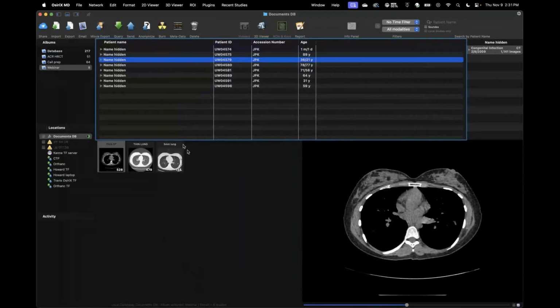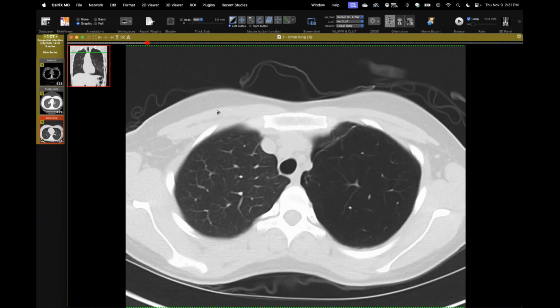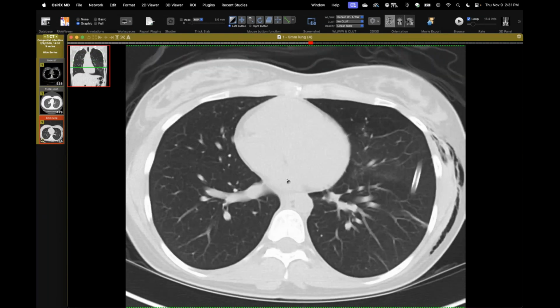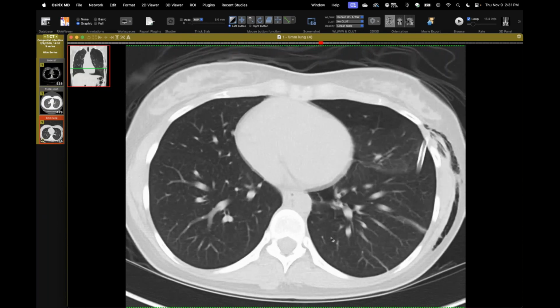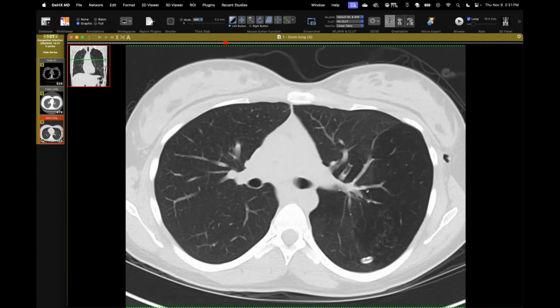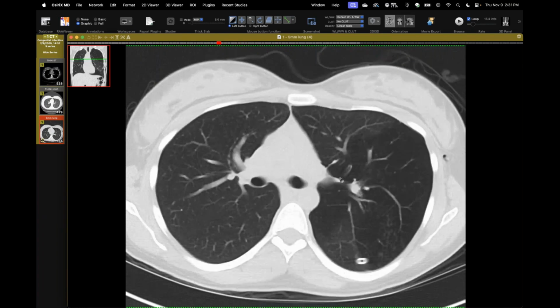This last case is kind of a fun case. I was going to show it previously. So this is an old scan. You can see this patient has a very abnormal lung, and I wish I had a radiograph, but I don't. At this point there's a small caliber pleural drain in, and we have these cystic spaces here, and then up high you have this hyperlucent lung and this dilated bronchus that comes down there and just ends, and a couple of other dilated blind ending bronchi.